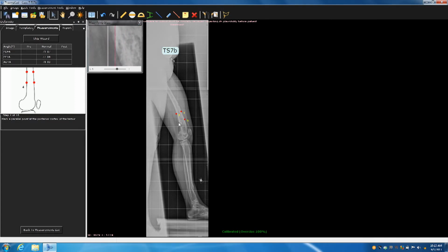And you can see this is the real world. You'll come down and say, okay, where is this physeal scar? You'll see that the condyles aren't completely overlapped, but you see a little bit of a physis here. And you come back and you'll see something that looks like a physis back here. And then we'll zoom in a little while and see if we're right. Your tibia, if you look, you have tibial spines, but this is actually a pretty good x-ray to find.